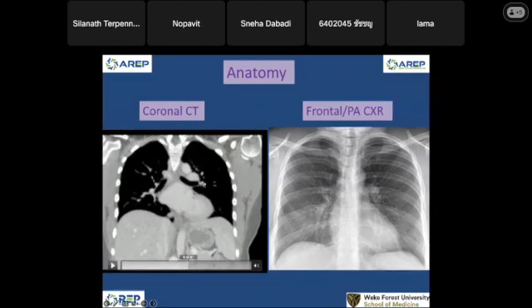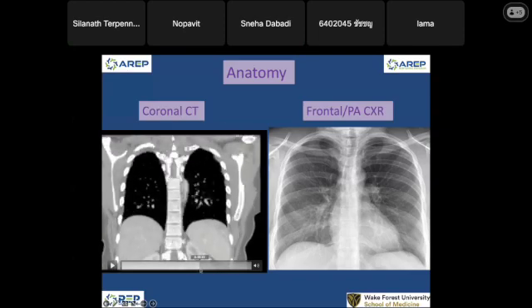So this part is the hilum. You can see this is my left hilum here on the chest radiograph. It has the pulmonary artery, a little pulmonary vein, and airways and lymphatic system that form the left hilum. The right hilum is the same way. Okay, so after that, going out and have gas exchange in the lung.